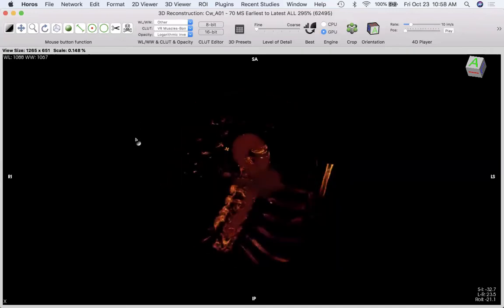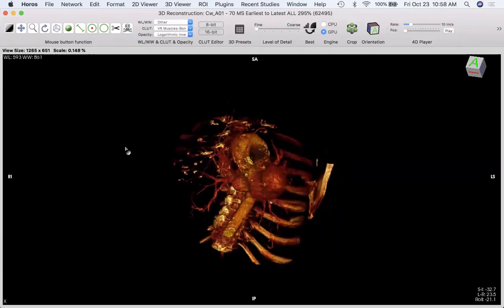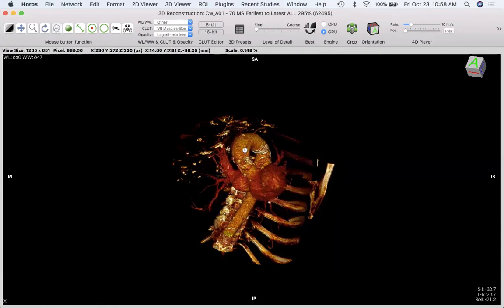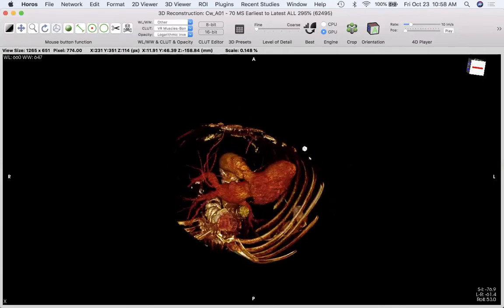So if I go down once again with that width, I can start to create. So now I'm moving at an angle. So I'm changing the width and the brightness at the same time. All right, this takes a little getting used to, but you'll get used to it. And so now you've set. Now let's click from the center and window control to this box, this cube, do a single click on that. And now when I press the left button and pull around, I can rotate the view angle.